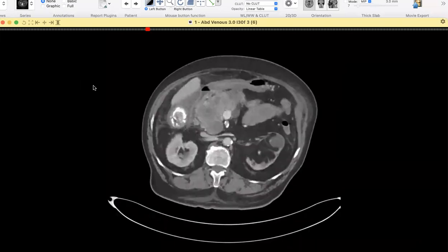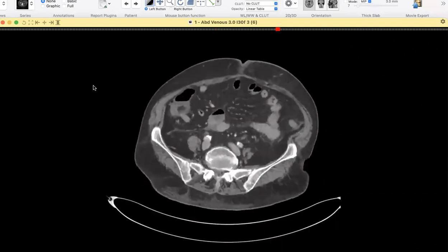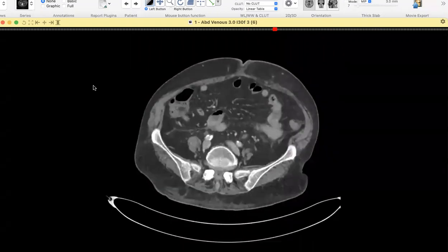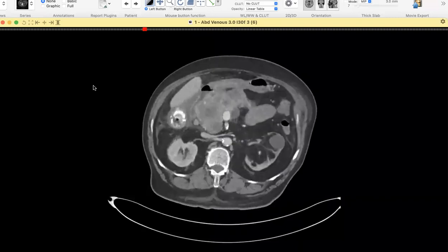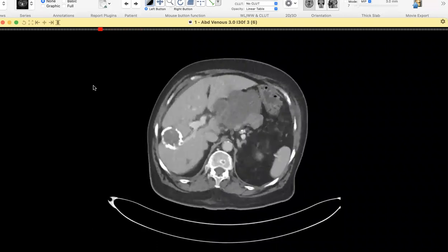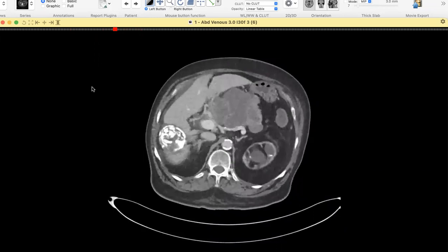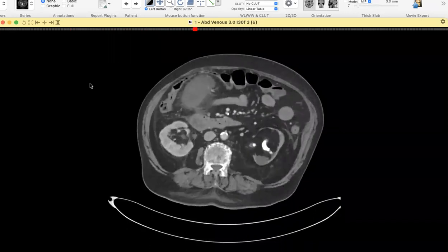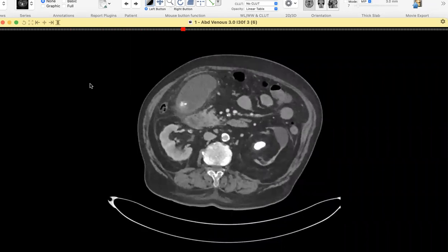Yeah, there is a well-defined calcification, and there is another. There is some lamellated stone, maybe ectopically situated within the small bowel. Maybe just go up. Yeah, what is this? Yeah, there is some lamellated stone. I think this is another thing. This is ectopic gallstone ileus. It is a gallstone in the small bowel causing dilatation of the bowel.